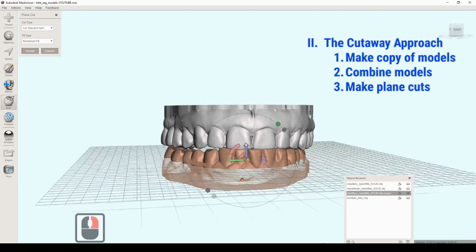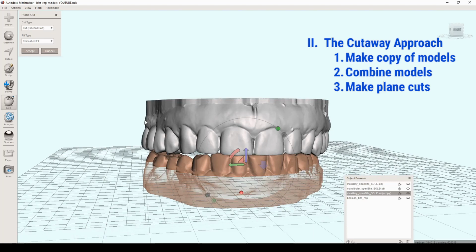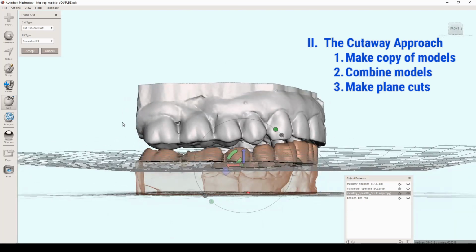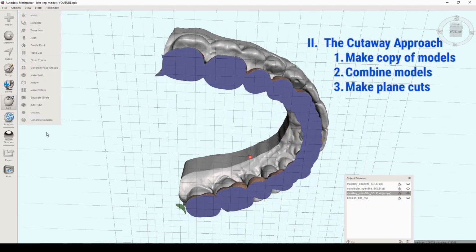And if you want to be even more specific and make it even a little bit closer, you could. But I think it's even better just to have about half the teeth there on each arch. So that's good. We're not worried about the height of contour. Plane cut that, and we're doing default values here, remeshed, all default, and we're going to repeat that on the upper.